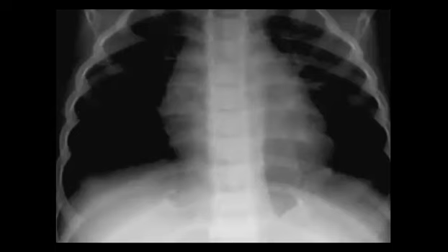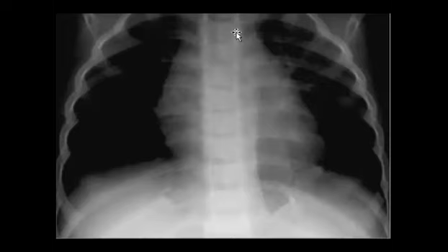Okay, as you like. So what do you think about trying to activate your checklist and find the abnormality here? It is not very easy, but I am trusting that someone of you will be our star again. So yeah, nice. You check for the line. Yes, perfect. The paraspinal lines. You remember the lecture of spinal paraspinal lines, tracheal stripes. So there is widening. I agree with you.